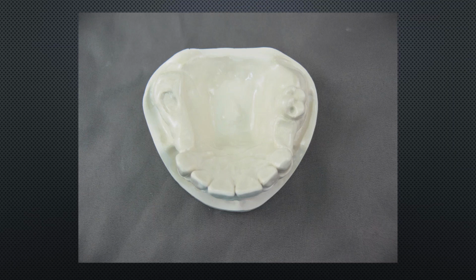There's the Flex Press, which is a fully automatic machine. It heats the flask up to the proper temperature and the material, and it's a push the button. It's like a porcelain furnace. You push the button and let it go through the process. So first thing you want to do is block out, using a sheet of base plate wax, which is about 1.5 millimeters, heating it up and pushing it down on the model. Usually we'll get it to about 8 to 9 tenths thick, like we have in our digital design, and then have that wax sitting there for your block out.